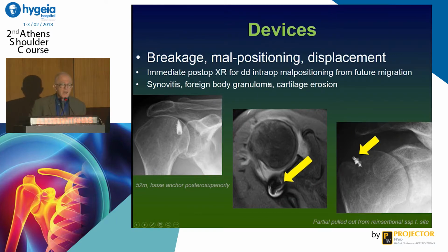So regarding the devices, we need to assess whether they are intact or have migrated, as this one, which has migrated posterior superiorly. We see here also the artifacts with MR imaging, or this one, which has partially pulled out from the insertion of the supraspinatus tendon.